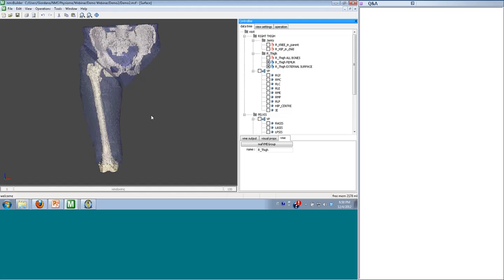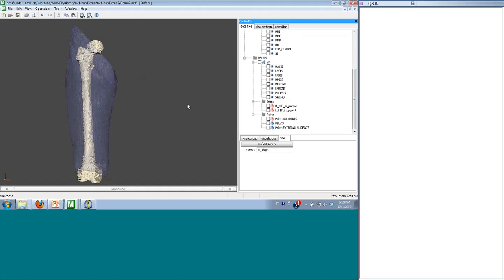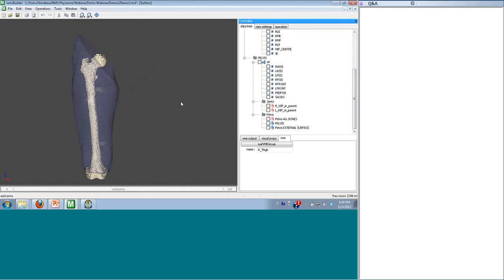And here, I'm going to show you, for example, let me again focus on the thigh body. I'm going to create the hip reference frame, because you know that in OpenSim you need to define the location and orientation in parent and in child. So let's focus, for example, on the hip joint. And let's say I want to create the hip reference frame in child, so with respect to the thigh body, according to the ISB standards, for example. That's what I did for my model.